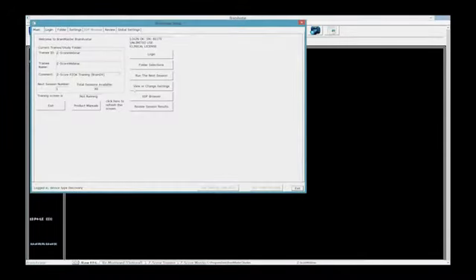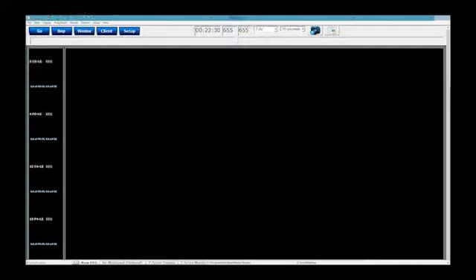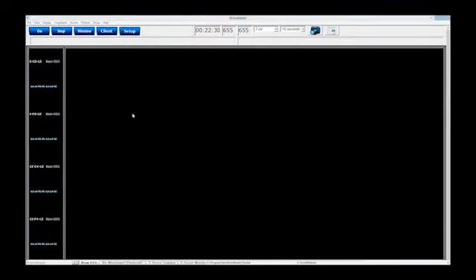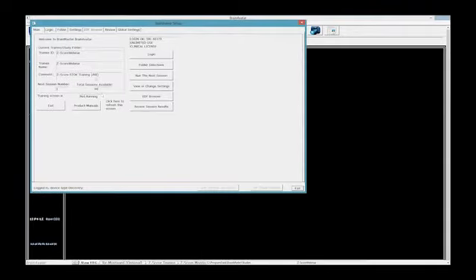There are different things that we put in there to help you keep track of which one you're doing. For example, in the comment, when you load BrainDx, it's going to have in brackets right there, BrainDx. And if I go File, Import Settings, Discovery Protocol, we go ANI, and we hit our setup button, you're going to see it now says ANI. This helps keep track of which ZScore training DLL you're utilizing, so you don't lose track of what's going on or who's using what. But the actual training themselves is not much different.